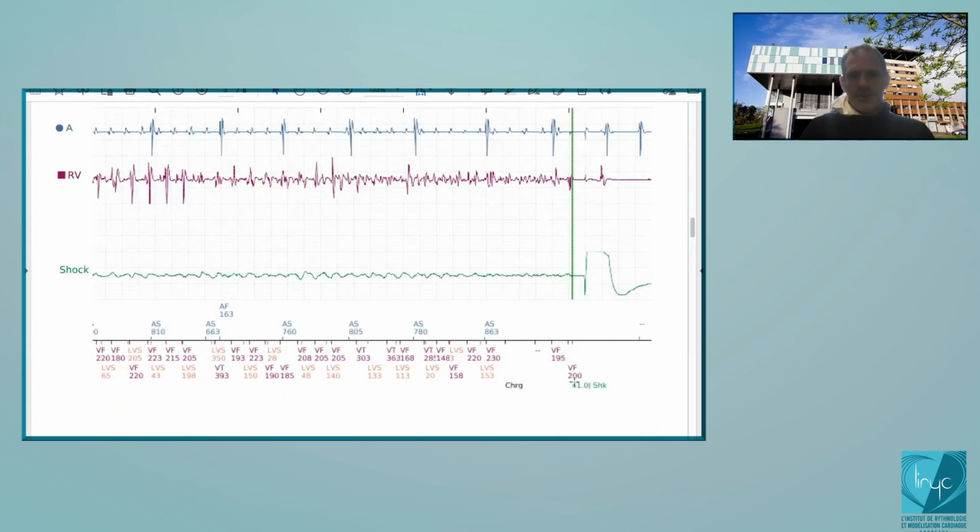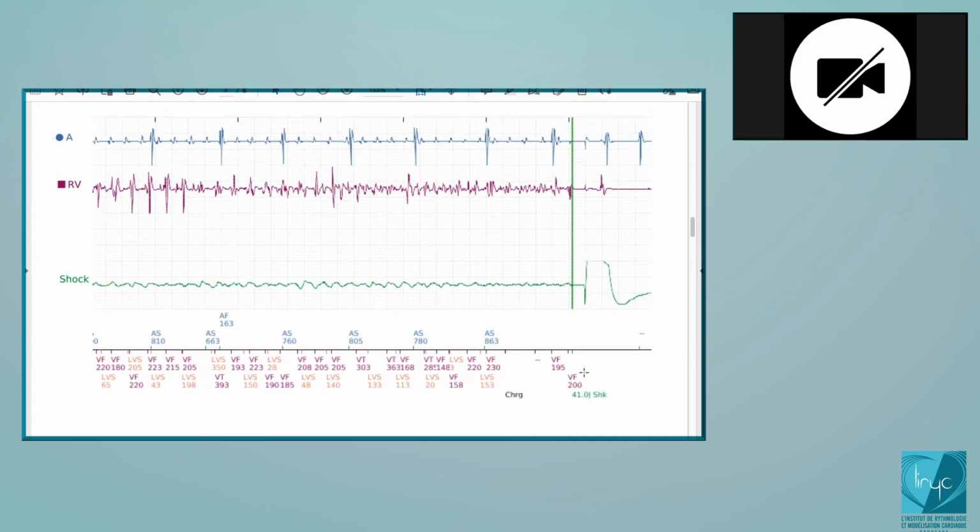At the end of the charge, you will deliver, first blanking here. So the next cycle is unclassified, 1, 2, and two out of 3 are fast. Then you deliver the shock. Clear for you? Good.